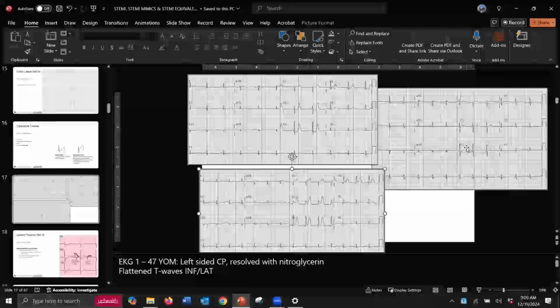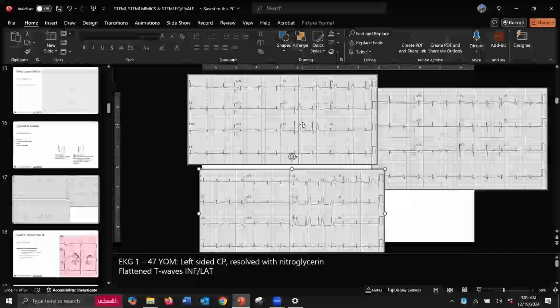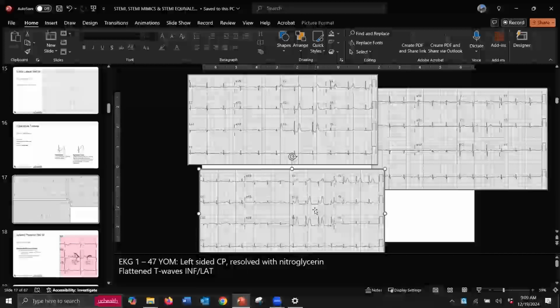And because I'm a good paramedic and I listen to the fat old man that has Depends and Aricept talking on Zoom and kept my electrodes on and did perform serial EKGs, and I got number 2, and I went, oh, that's kind of a change. Notice one thing here, that we don't see much reciprocation yet, though, right? This is the evolving. And then number 3, they become huge. We start seeing the ST segment elevation in V2 and V3, and this is going to continue to evolve until such a time that they get to the cath lab.